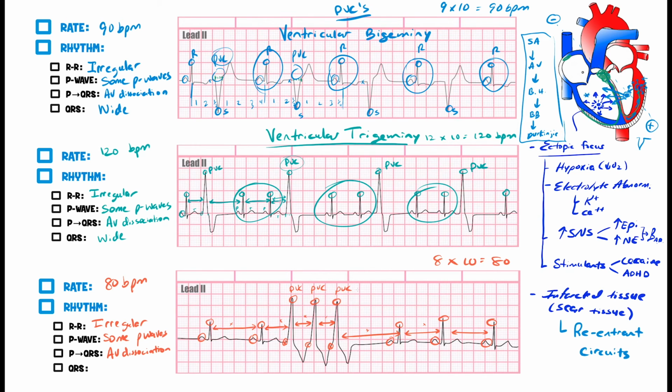Now here's the thing. PVCs can cause palpitations, right? And sometimes we're going to get to another rhythm, which we're going to talk about. This son of a gun looks a lot like something called VTAC. So whenever you have something that is, again, look at the R to R interval here. Is it about the same? Yeah. So what would you call this? It's 1, 2, 1, 2. If something is about the same R to R interval, what is that?